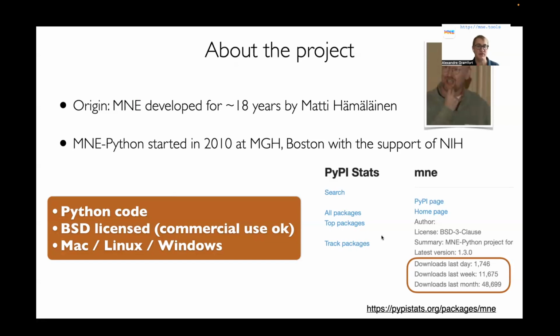So MNE-Python is obviously written in Python. Python is a now very famous language that has kind of taken over the world of data analysis and data science and machine learning. MNE-Python is BSD licensed, which means that you can use it even in a commercial product. It's completely okay to do this. And it's pure Python code, which means that it runs very easily on any operating system from Mac, Linux to Windows machines.